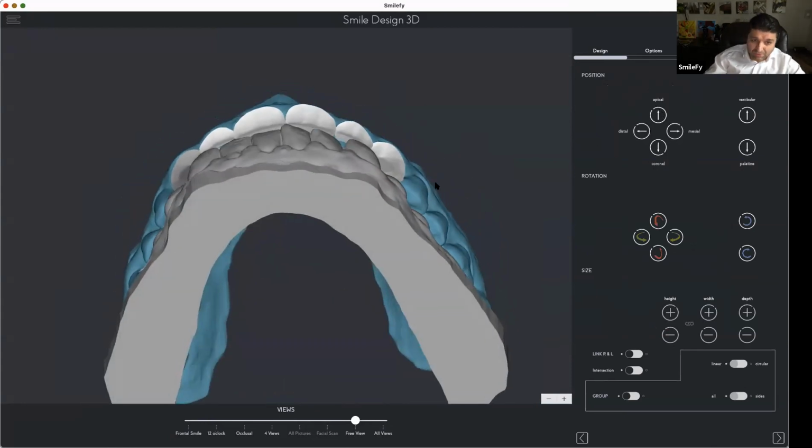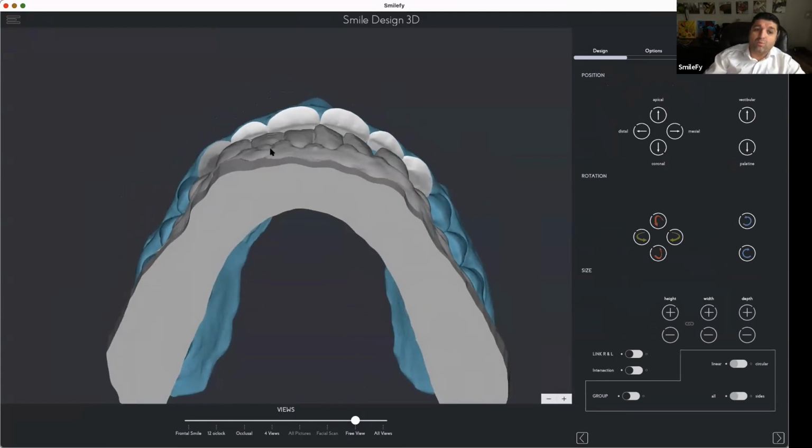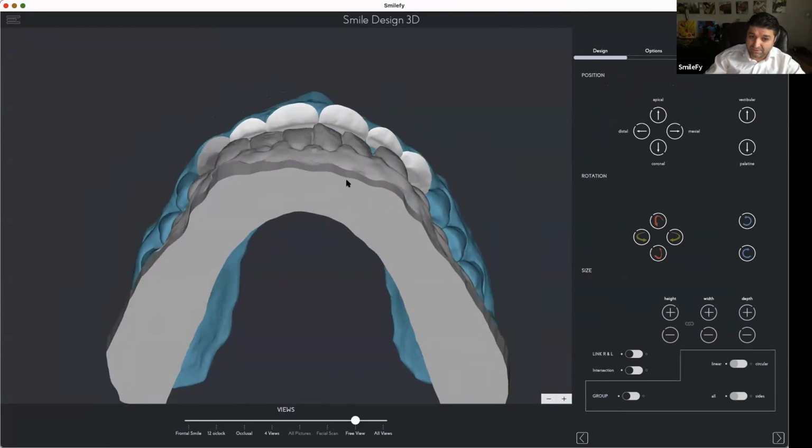And now we can show the patient what is the problem. We can discuss the complete treatment before we do anything else. That's the beauty of the digital workflow. We can design, we can have an idea, a first version of the treatment planning, we can create a design, we can create everything, then we see it's not working, so we need to adjust also the treatment planning.